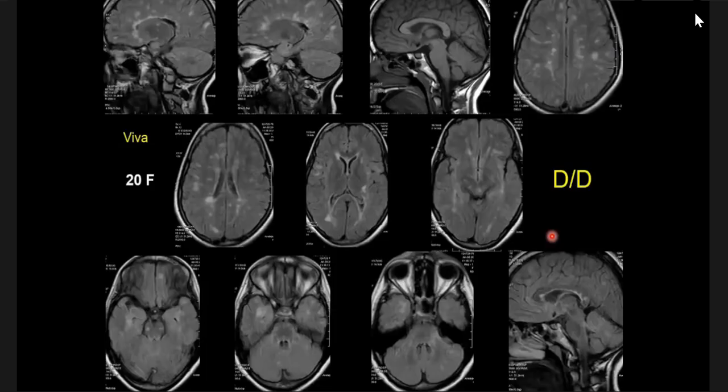So I think my first diagnosis would be multiple sclerosis, given the distribution, because I can see septocallosal changes, Dawson's finger, subcortical white matter changes. I'd like to know, without any previous imaging, we don't know if there's any new lesions, and we don't know if any of them are enhancing to further characterize if they're lesions of different time and space. But I think my primary diagnosis would be MS for this patient.